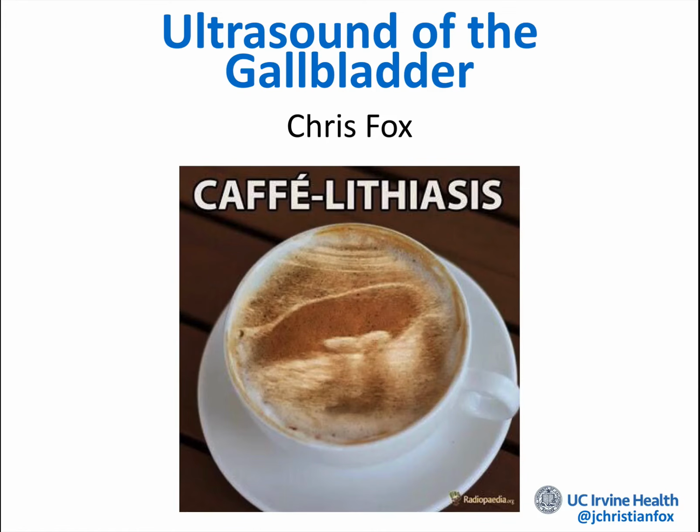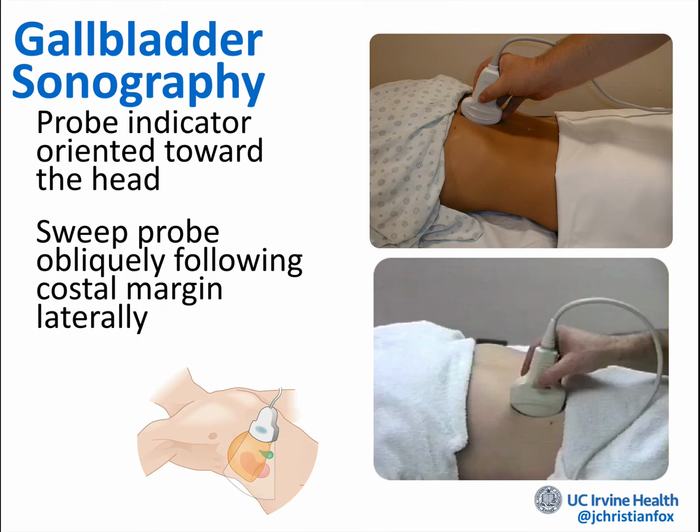Okay, switching gears now to talk about the gallbladder, one of my favorite topics because ultrasound is so perfect for the gallbladder. It is one of those times when the ultrasound actually does better than CT scan.